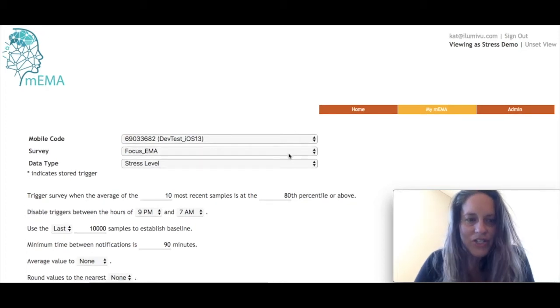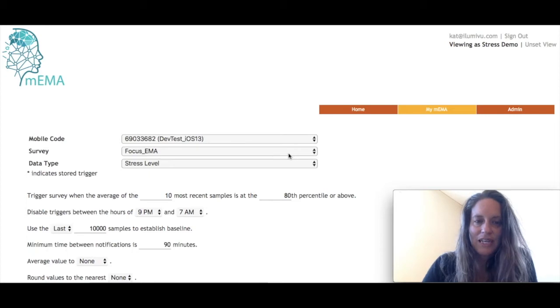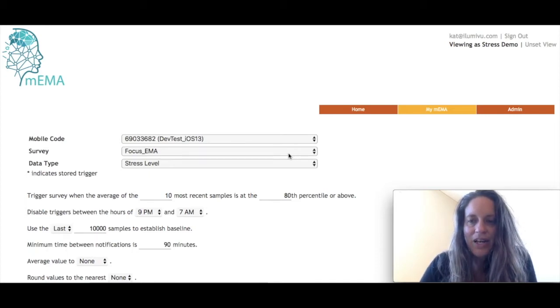So in this video, I'm going to show you how to create triggers for intervention content based on physiological data. Basically, when the wearable picks up that there's been a significant change in physiological data, and we can look at which different data types we can use, it's going to trigger an event on the phone to send a notification to the user, which they will click and it will take them into the mEMA app. And then what they see is then up to you.